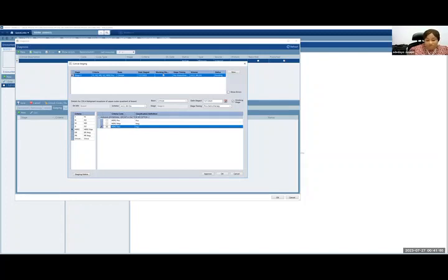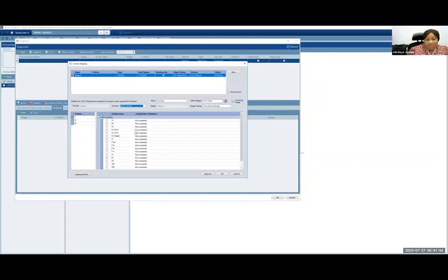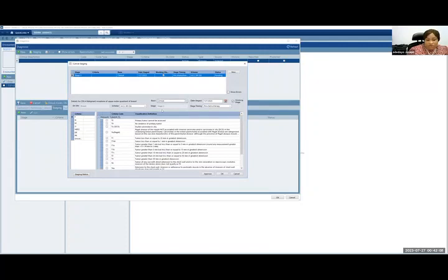We have two options here. You can use an older staging method and clarify that you use the 7th edition, which I don't think is ideal, because it doesn't even show you what the parameters are. You basically have to do it from your head. Or you can stick with 8th edition and change to custom. Now, custom means that you decided to use anatomic staging. And what that does is that you will still fill in all the parameters.